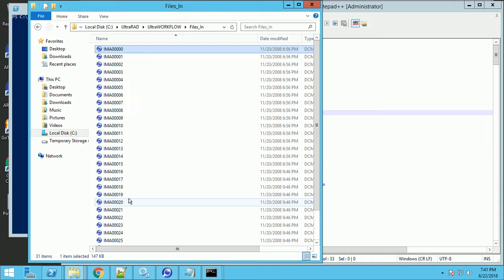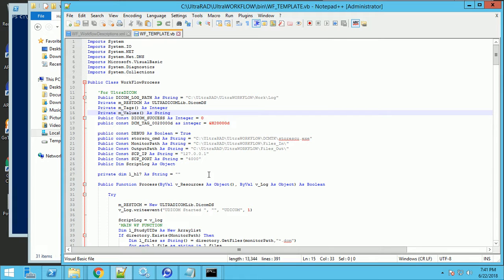And what I wanted to do is write something where I loop through the files, I organize them by their study instance UID, and then I try to send them and try to catch any errors and resend, if I can, a different way. So let me show you my solution. I did introduce something new in my solution, which I'll explain.